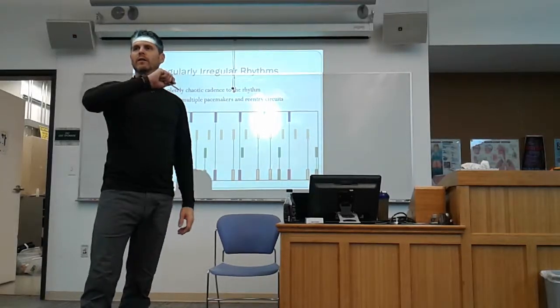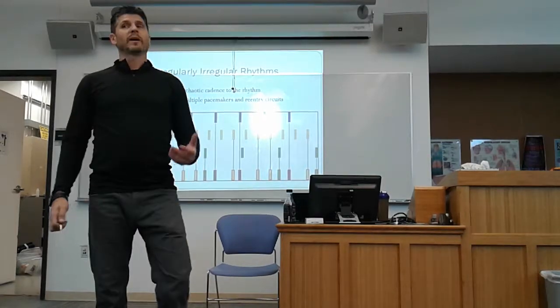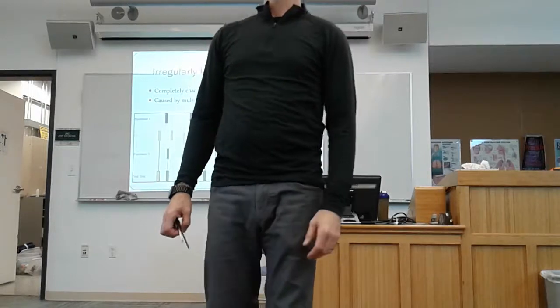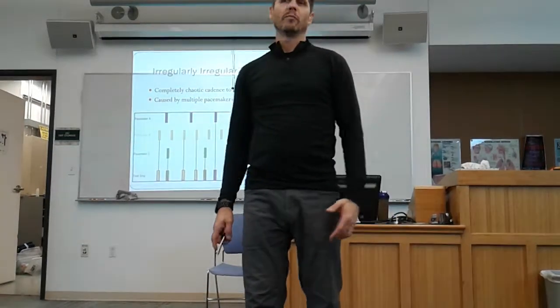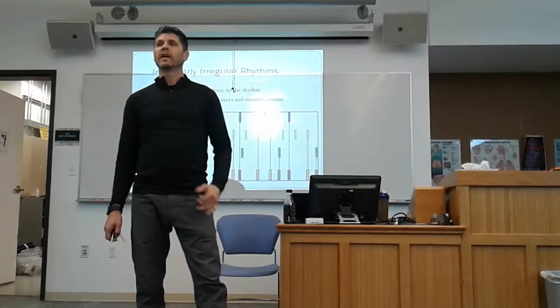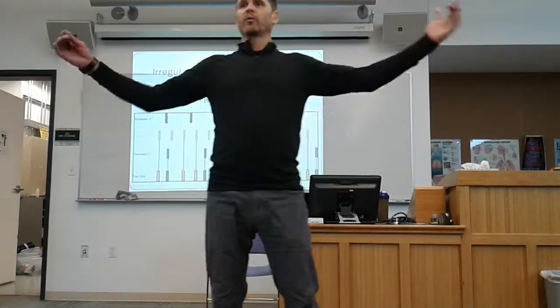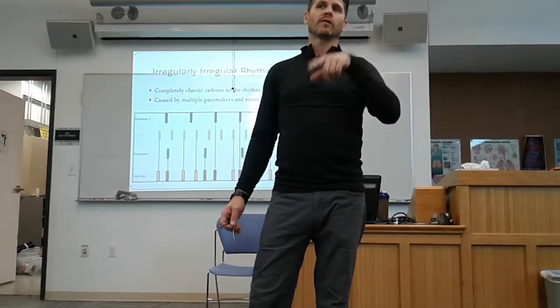How long of a strip do you look at to determine whether it's a pattern or not a pattern? It depends. It really does. Some of them you can pick up immediately on a 6-second strip. Some of them you're going, no, I need to have 12 seconds or maybe even a full minute to really find out if there's a pattern to it. And some of them, based on our knowledge, we assume there's a pattern and then we confirm it with a longer strip. And you can sometimes just do that dynamically by watching it. And I'll give you some of those examples.